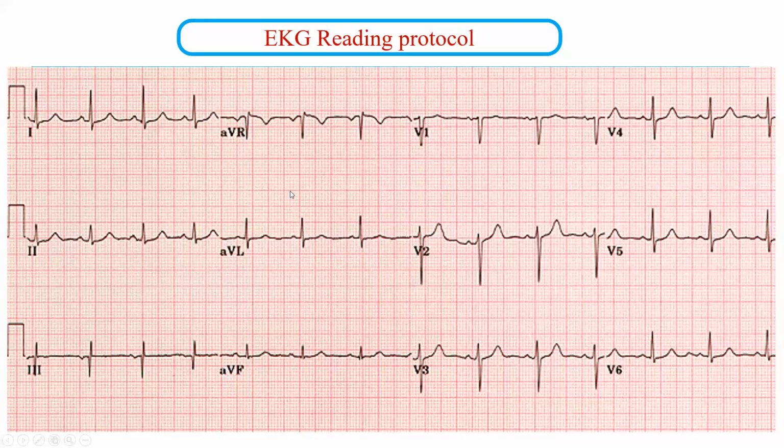Okay, how to read this EKG now? Let's see. You can take any QRS complex, but you need a good T wave to determine the QTc. So from the beginning of the QRS complex till the end of the T wave, this is the duration. If you count these squares, it's almost 10 or 9 squares here. Okay, and the RR interval is from here to here. So by eye, you can tell that this distance between the two red lines is less than half of the green distance, which is the RR interval. So this is a normal QTc. Okay. So now we finish the intervals.